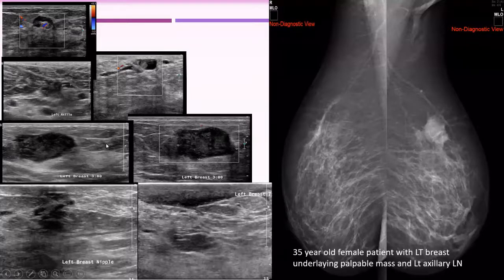It is a mixed echogenicity mass with angular margin. And where is the angular margin? At the left part. Indistinct. Okay, no problem. It is indistinct; you can say there is some spiculation. Okay, accept it. And this is the left retroareolar skin. Look how it's thickened.